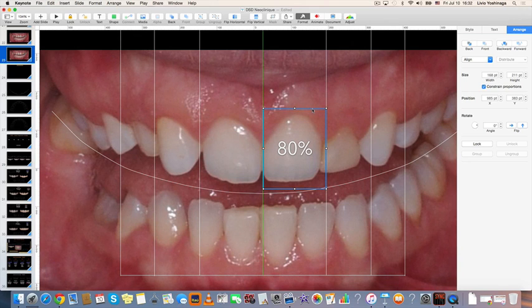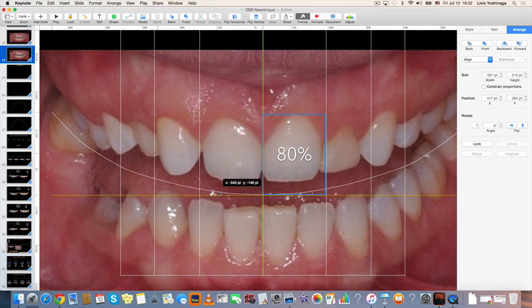So you can decide here, look into the movie, hearing what she says, and also you can change this at the end of our project by moving the individual teeth here. So let's make sure we don't do a surgery here. This is the exercise we've done here in beautiful Bucharest. And we're going to adjust this curve.